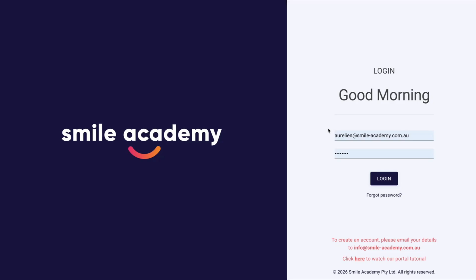First step, enter your login details. If you don't remember them, you can click on the Forgot Password link to get new ones.